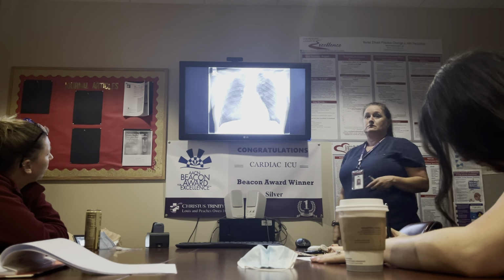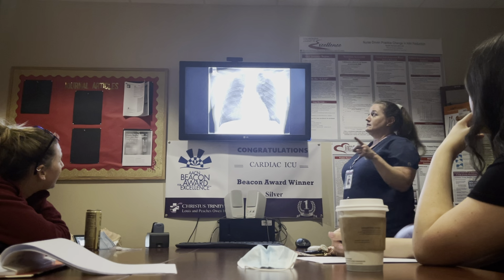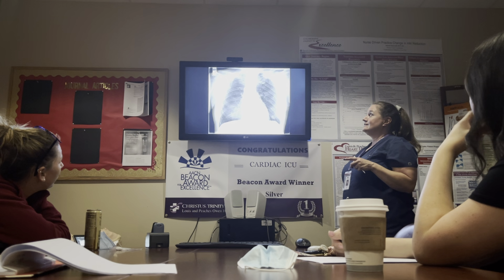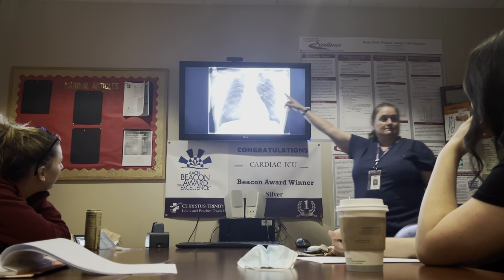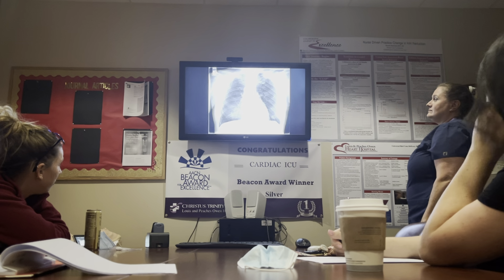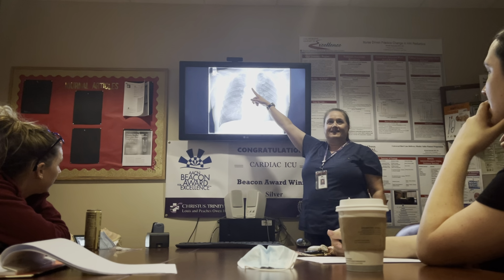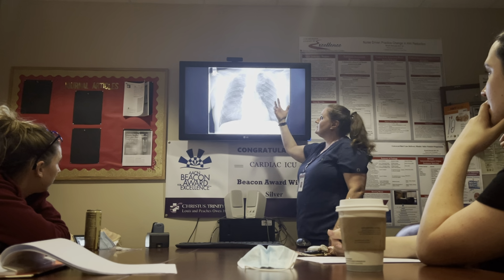What's going on here? Correct. So, okay, look at where the label is. It's a PA lateral. No, it's just labeled wrong. Mm-hmm. This is dextrocardia. That's not the left side. This is the left side. But everything is flipped, okay?